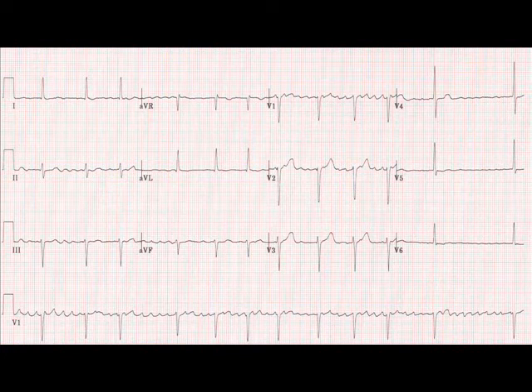If it's irregular, I've told you what I suggest, and the different ways of doing this. Count 30 large squares and the number of R waves within that 30 large square period, and times that by 10. It just picks up a little more of the irregularity. But really it's best to take the patient's pulse for a full minute, and as I said before, you'll gain a lot more by feeling the pulse, character, strength of pulse and so forth.